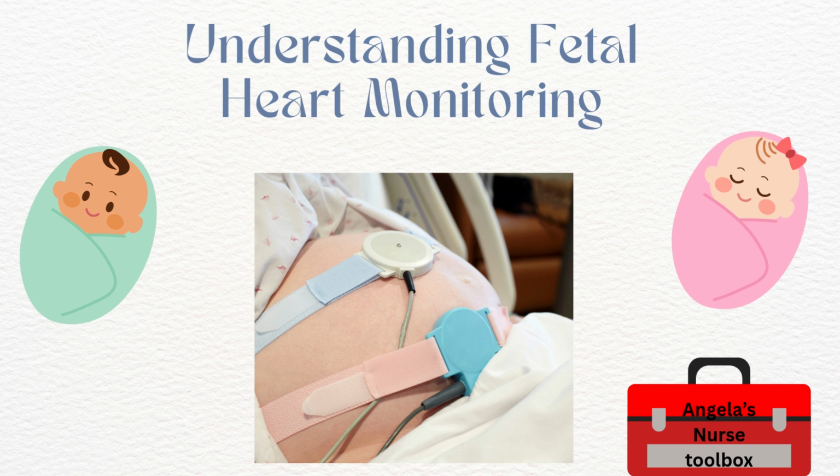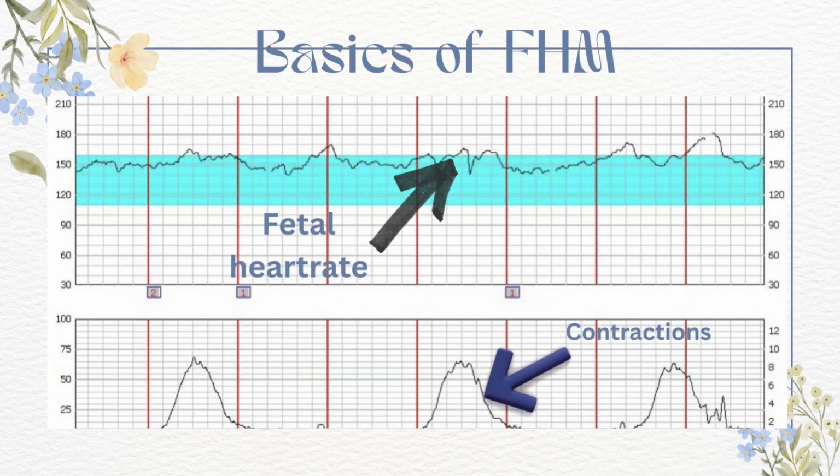I'm going to talk to you today about understanding fetal heart monitoring. If you are in maternity clinicals, you want to have at least a basic knowledge of what you're looking at on the fetal monitor and know when to respond and how to respond. So, our first strip is some basics of fetal heart rate monitoring.